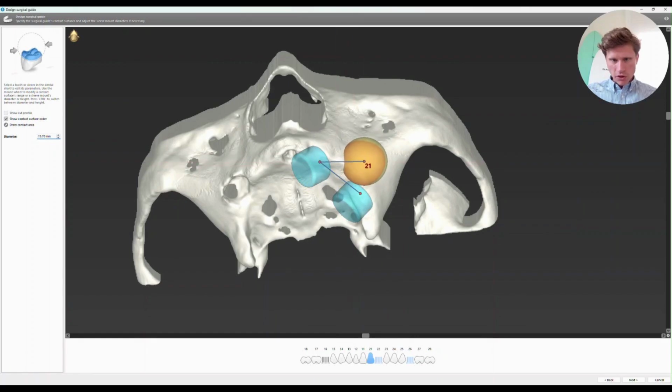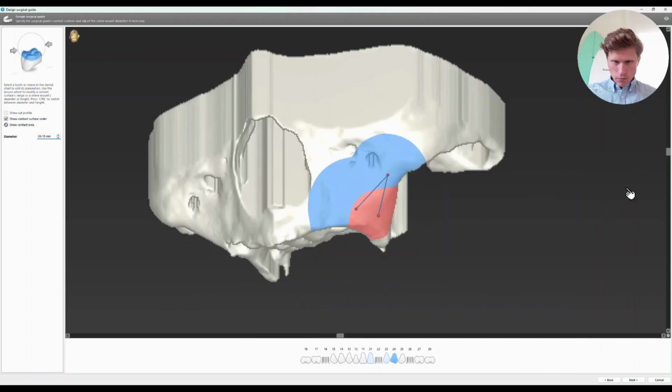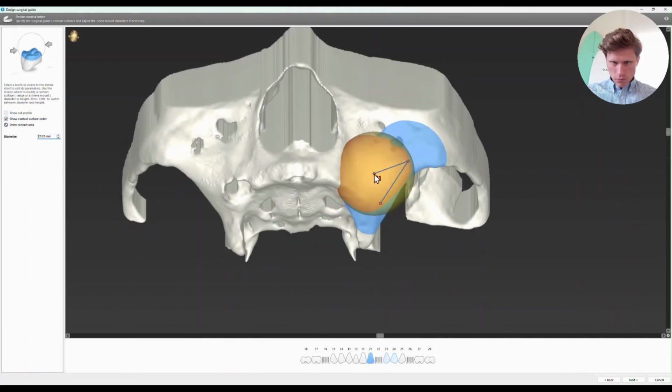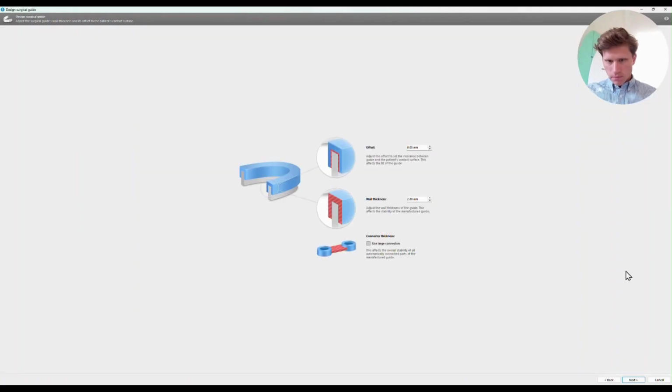Maybe I can put something really, really big, and next again.